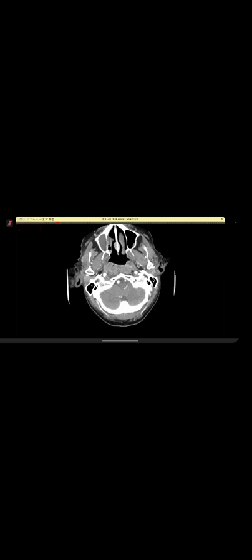Now, on this contrast, actually, this patient was also a stroke patient. So they asked for CTA also because of the clinical. Now, do you see these longus colli muscles, and this is invading inside into them.